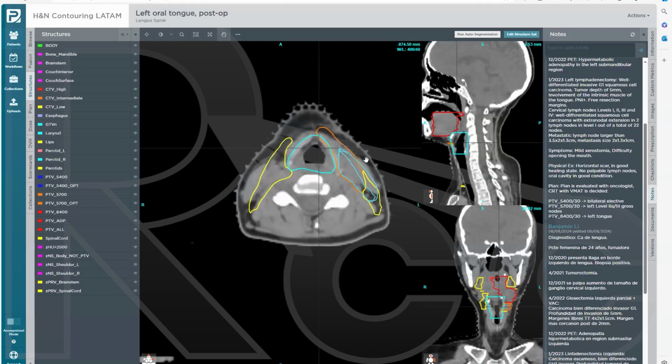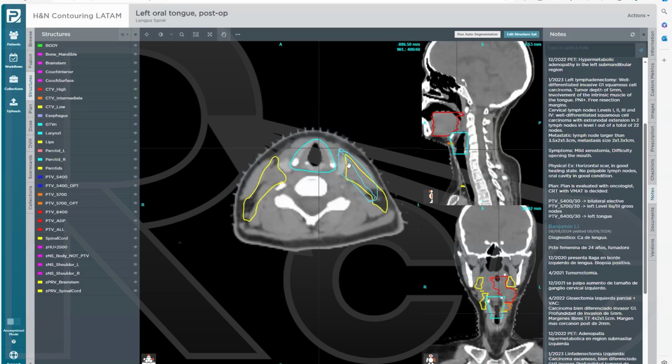Another thing going lower down when you're drawing: let's erase these now. So medial border, this is another common issue, is the thyroid gland, right? Without contrast, you can still see the thyroid clearly here. So you don't want your contour to go into the thyroid. We know it's going to receive incidental radiation dose, but our target volume is not the thyroid here. So we should stay lateral to the thyroid and include a thumbs up sign here, and then bring it here.